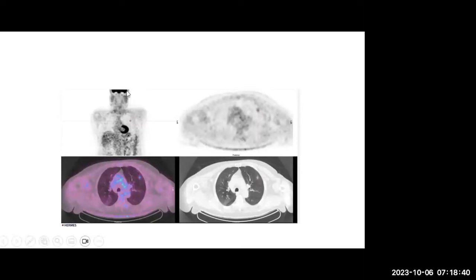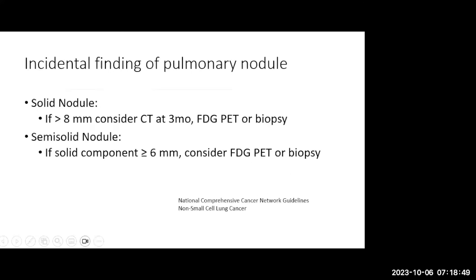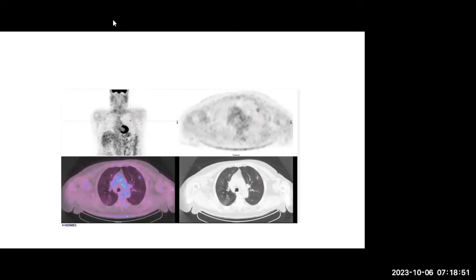So first, as I mentioned, the first image I showed you was a 3D. This is not. This is just a cut. These three here are the axial cuts, right? This is a coronal. These two images on top, the black and white, are the PET-only images. This is, of course, the CT that you can recognize, and this is the CT and the PET superimposed, which is called the fused image or the fusion image.